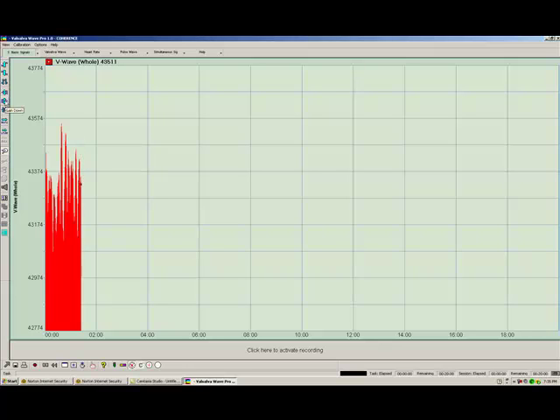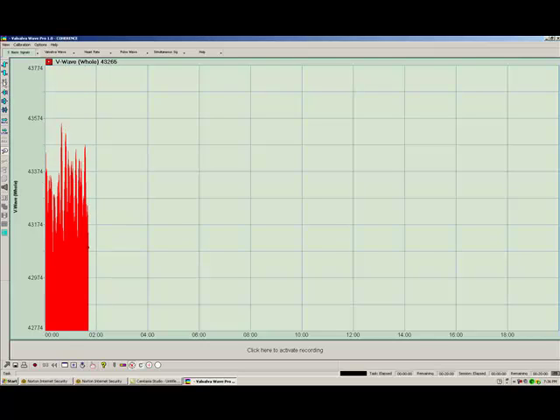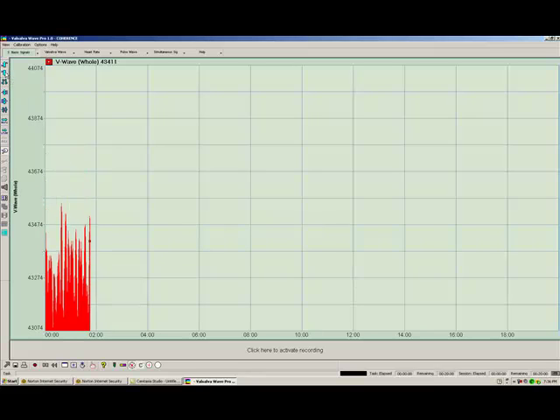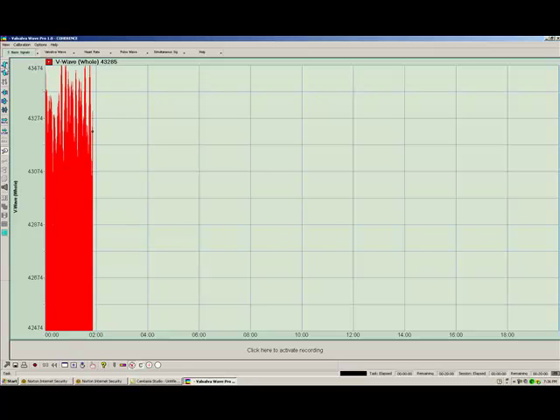Above that is to lower the gain. If we would like to scrunch the signal down, you see that? We're lowering the gain. Or raise the gain back up. I'll lower it back down slightly. Here we can shift the curve downward on the graph or upward on the graph matrix. All right, that makes sense to everyone?